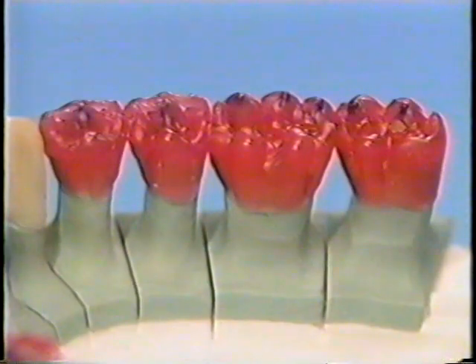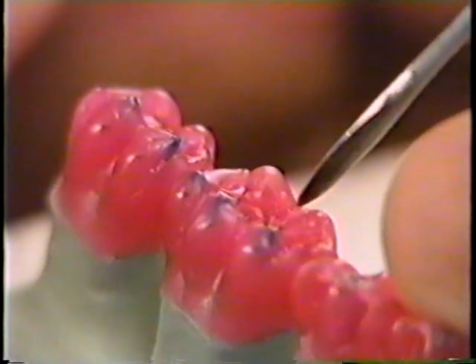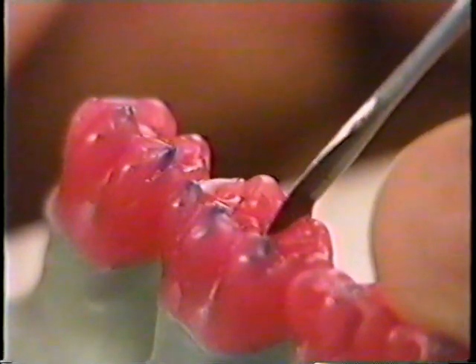We'll form the lingual ridges based on the morphological linkage between the cusps and the roots. We'll also take into account the relationship between the cusps and fossae during mandibular movement. By forming the skeleton in precisely this way, each molar's contours are both functionally and anatomically accurate, eliminating the need to perform any shaving.